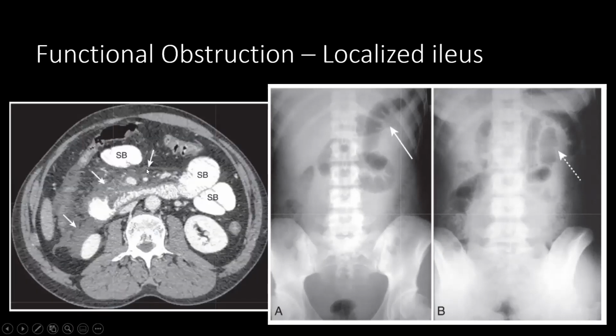When I look at this, this is a patient who is having pancreatitis. This is the pancreas and it is very dirty. Here is the continuation of the small bowel, but here you can see a distorted appearance of the pancreatic tissue, with a distortion also of the normal peritoneal fat. We call this in radiology dirty fat planes. When I see these dirty fat planes with this appearance of the pancreas, and these small bowels dilated more than their caliber.